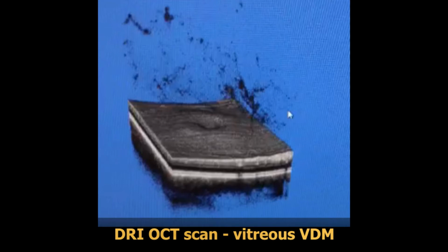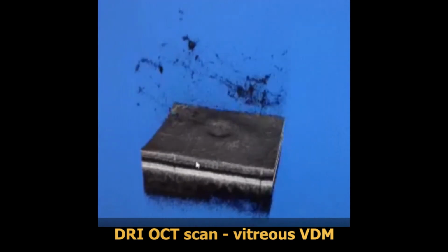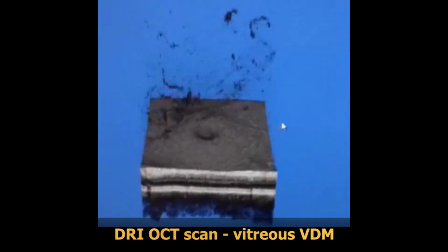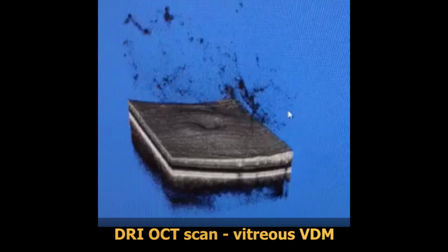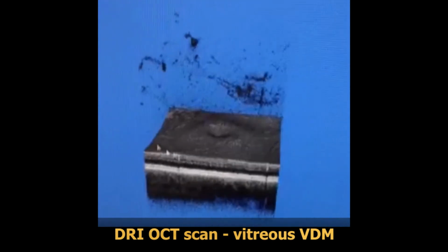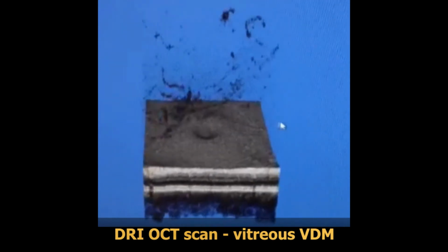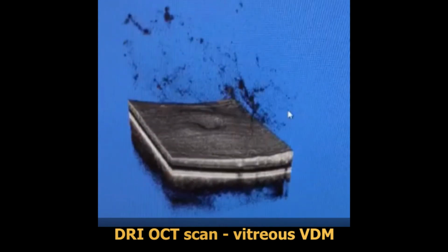Ultrasonography can image these structures and has been successfully used to evaluate patients complaining of vitreous floaters, but the resolution of sound is not as good as the resolution of light. Therefore, this imaging is superior, although the optics limit the extent of the vitreous body that can be imaged and visualized with this technology. Furthermore, this is simply a graphic illustration of the opacities, and there's no quantification of the number or size of the opacities in the central vitreous.